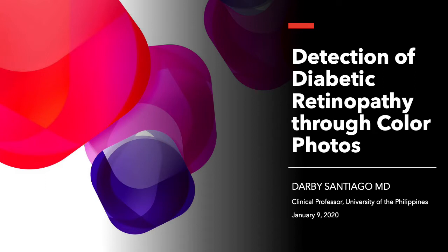You base this on the fundus photos. And if he does have diabetic retinopathy, you should be able to classify whether he is in the non-proliferative stage or in the proliferative stage. But for advanced students who would like to learn more about the sub-stages of diabetic retinopathy, there will be a separate training lecture module for that. Okay?